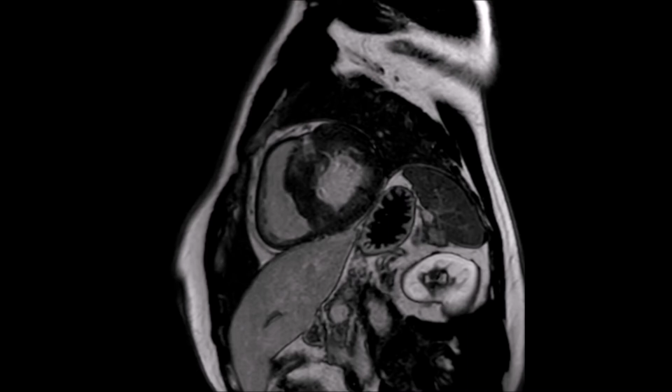Its location is generally at the level of the left ventricle with a classic pattern of intramyocardial patching at the level of the areas of greatest hypertrophy and in the areas close to the junction with the wall of the right ventricle. It is present in advanced stages and is related to ventricular arrhythmias and sudden death.